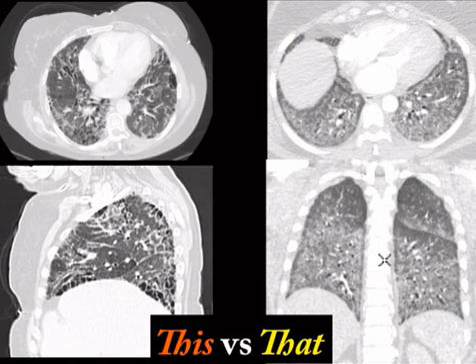And there are certain pathologies, and you need to memorize which ones, that have an upper lobe predominance or a lower lobe predominance, because that lends itself well to multiple choice as well. But classically, UIP gets worse in the lung bases. So you can see that even though there is some honeycombing, which is a buzzword, in the upper lobes, there's more of it in the lung bases.